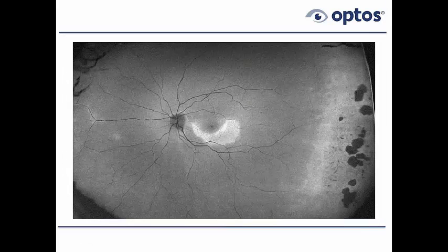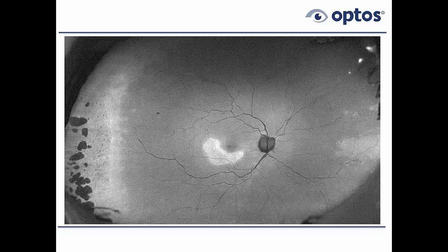Now these are hyper-autofluorescent, suggesting that this is a metabolically active zone of retinal pigment epithelium. It's sick. It hasn't died yet. There's nothing. There's no hypo there. So we don't have deaths. This is probably a relatively recent phenomenon, interestingly enough.